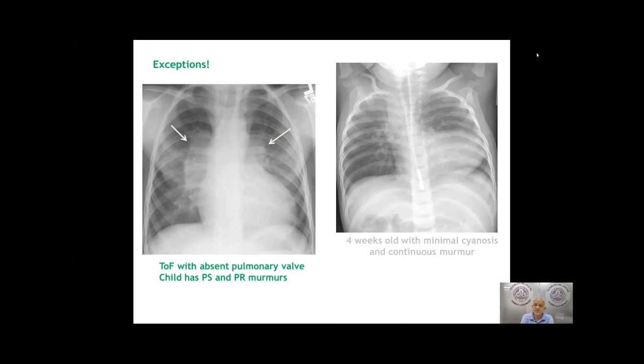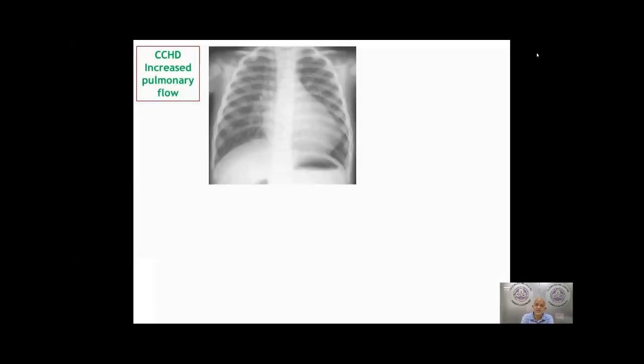One expects a patient with TOF to have decreased blood flow, but that is not the case. You can see the vascularity is markedly increased, and you can see the vascularity extend to the lateral third. So if I have a child's X-ray with TOF-like physiology but increased vascularity, the patient is likely to have marked collaterals, and so there is a very strong possibility that the patient has VSD with pulmonary atresia or increased MAPCAs.